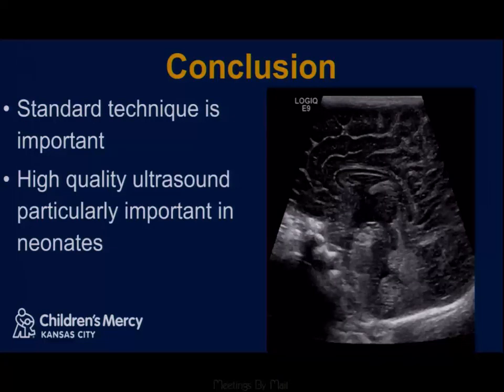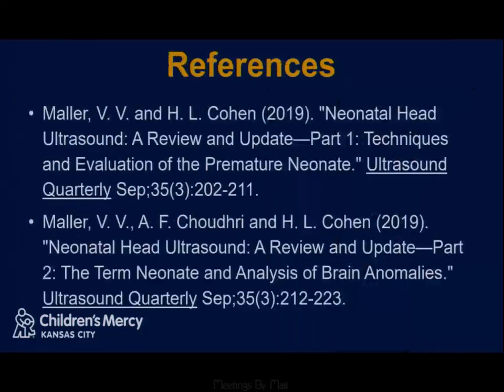I showed you many cases where you really want to see those 3 layers of pia, gray, and white matter. And I think that linear transducer is really helpful for that. And I think looking out for that in your day-to-day practice is really going to help you make a lot more of these subtle diagnoses.